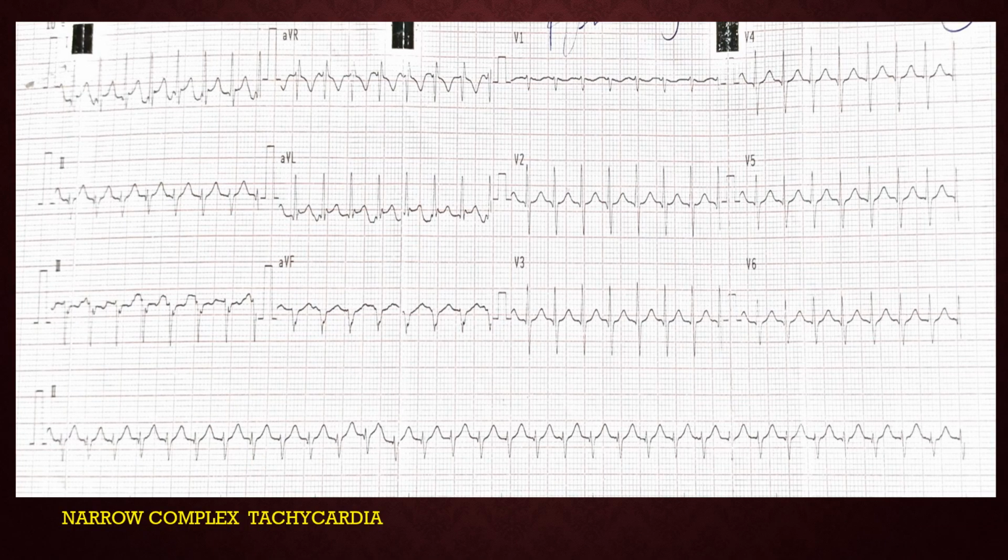To start with, first of all, we need to define the tachycardia is a narrow complex or a broad complex. So in this case, this is a narrow complex tachycardia, and we can see these narrow QRS complexes, which are pretty obvious over here in all the leads.